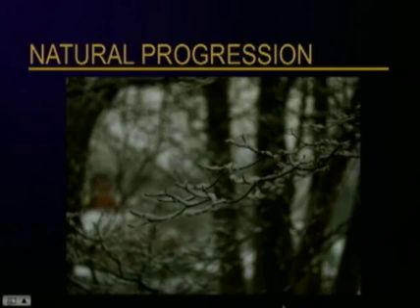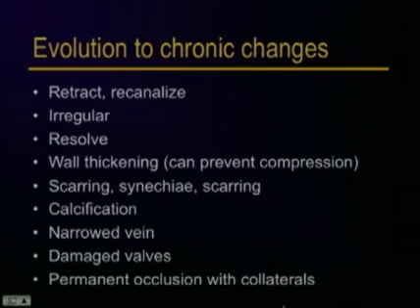Okay, now what does thrombus do over time? Well, it may completely resolve. It may retract or recanalize. It may appear more irregular over time. Over time, the vein may become scarred, and you may have remnants of the thrombus with synechia or scarring. There may be wall thickening, which may prevent compression and present as a pitfall to your evaluation of the vein.